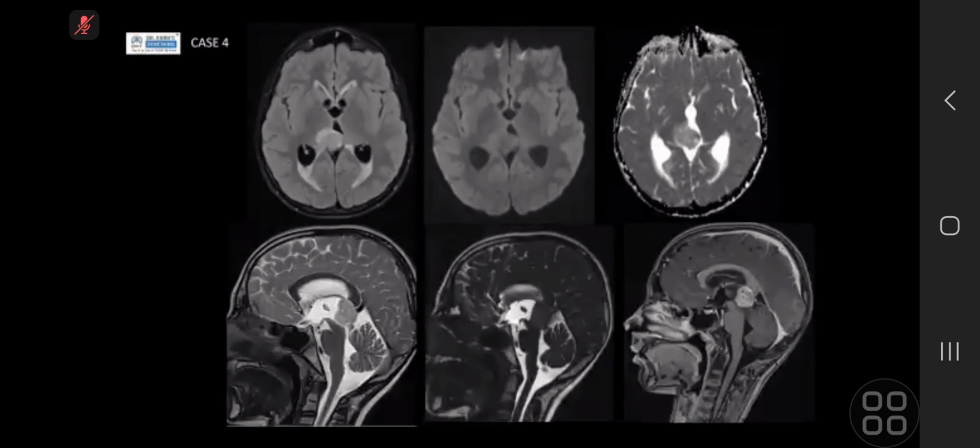Okay. Yeah, so good, well done. I've got the same differentials as you. You can see here that's the FLAIR. You've got this heterogeneous lesion here, and on the DWI and ADC, there's probably a very mild degree of restricted diffusion, because there are certain high and low areas on DWI and ADC. And on the CISS sequence, which allows you to see CSF, at the cistern you can see that there's obliteration of it, with resultant prominence of hydrocephalus of the lateral ventricles, and it's quite heterogeneously enhancing as well on the T1 post-contrast sagittal.